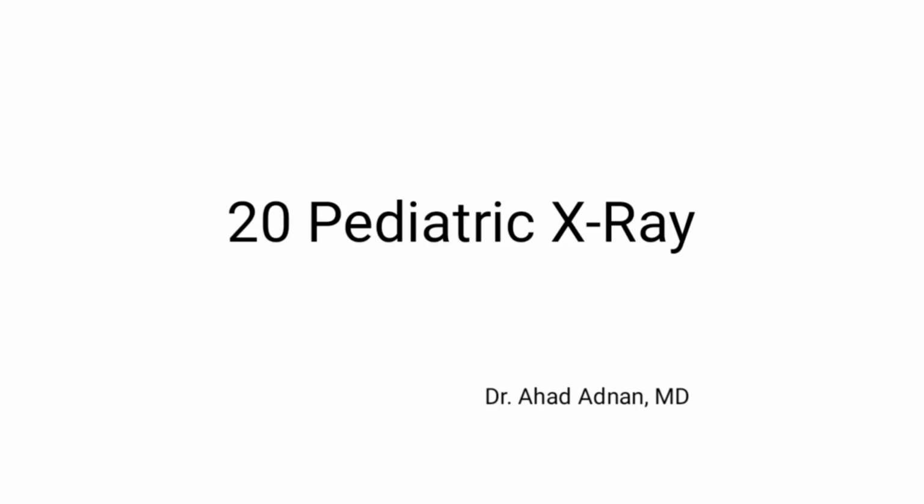Today in this video, I'll show you 20 pediatric X-rays which may be found in our daily practice as well as OSPE examination. So let's start.